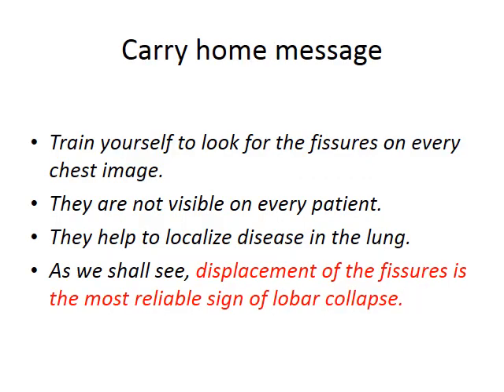So take home message. Train yourself to look for the fissures on every chest image. They are not visible on every patient. They help to localize disease in the lung. As we shall see in further classes, displacement of the fissures is the most reliable sign of lobar collapse.